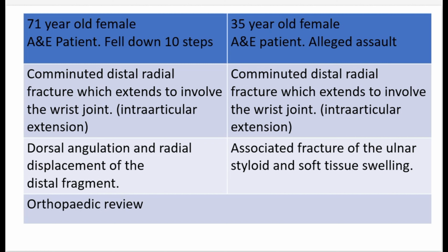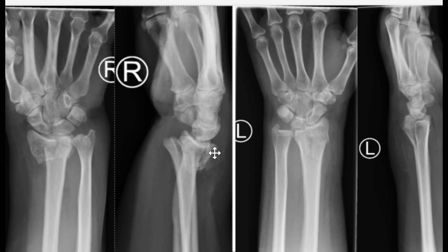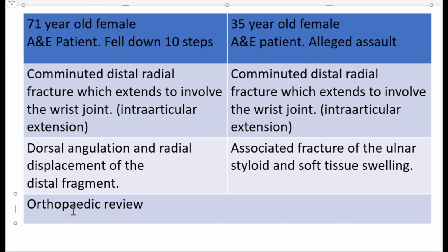So there is dorsal angulation and radial displacement of the distal fragment. The management here is orthopedic review. So let's start the second case here.